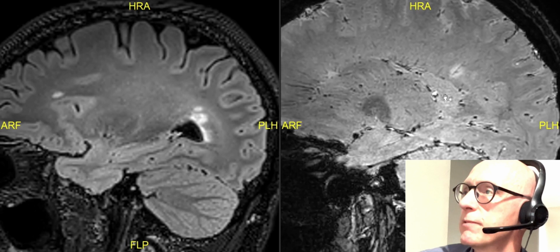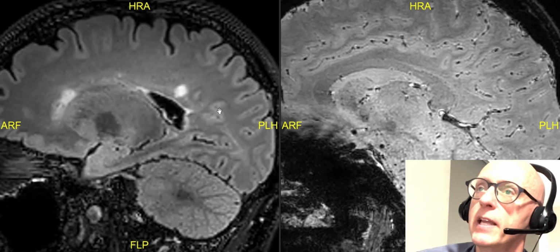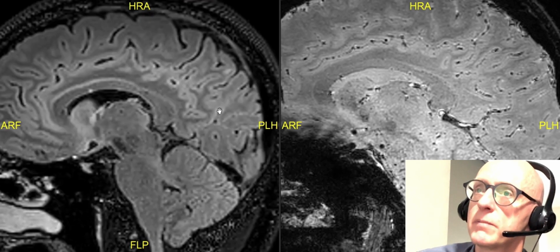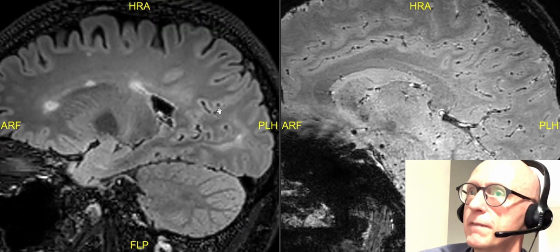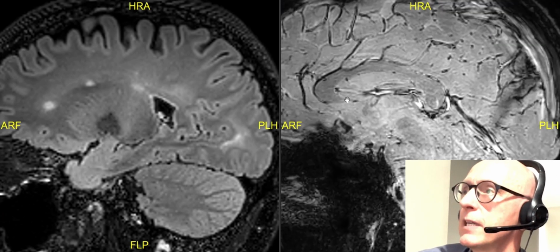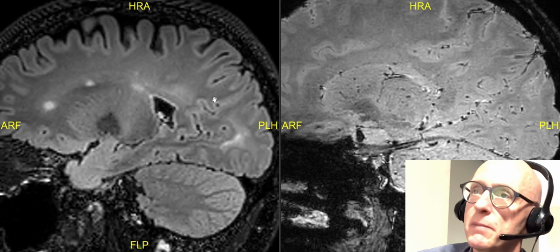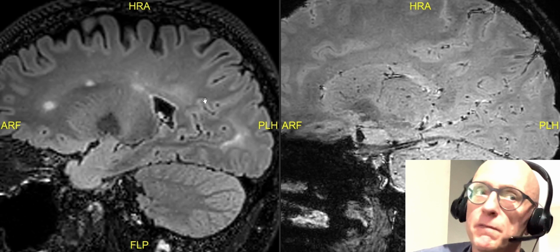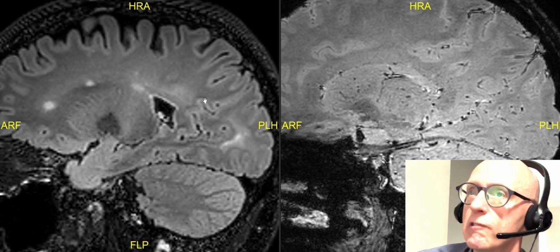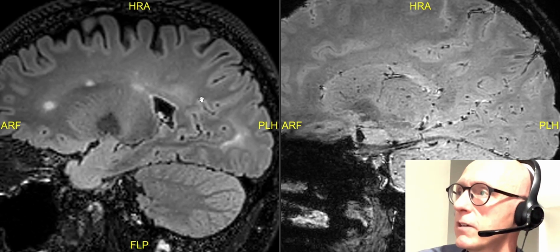And obviously in some patients with really quite advanced disease, you'll have large areas of T2 hyperintensity in the periventricular white matter. And in those cases, sometimes it can be quite difficult, in my experience, to identify a clear, discrete lesion with a single vein running through it. And that can be a problem, actually, when we use this technique to try and differentiate MS from people with ischemic small vessel disease, particularly in people who are slightly later on in life, where there is confluent disease, but we sometimes struggle to see a discrete lesion with central vein, or certainly struggle to see enough discrete lesions with central veins to confidently make the diagnosis.